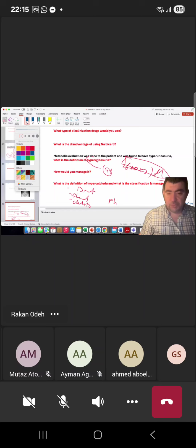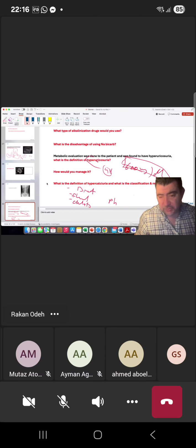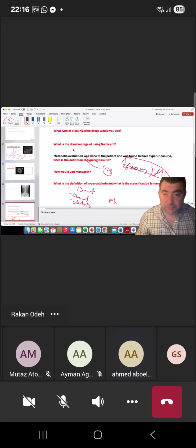Okay, fair enough. How do you think you did? You tell me. I think you did well. The question in this scenario is a little bit difficult, like the hypercalciuria definition and management, but you went through it very well. You started with this CT and went through it perfectly. You asked for the rest of the images, went through them perfectly as well, and you diagnosed the radiolucent stones. And you went through the alkalization process as well.